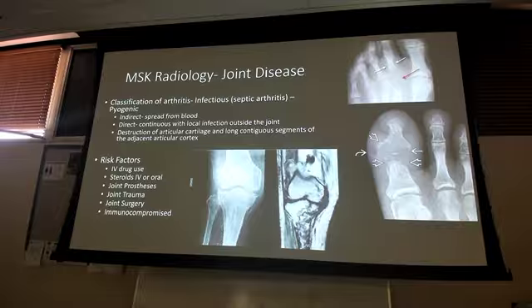And then look at what it's doing. It's starting to erode the bone around it, and in some cases, completely erode the bone, right? This is severely painful. It starts off as the infection, and then it turns into a septic arthritis. Now, I get this question often.